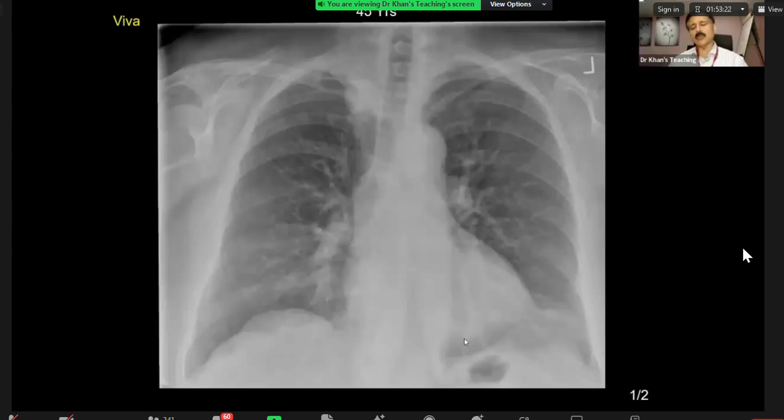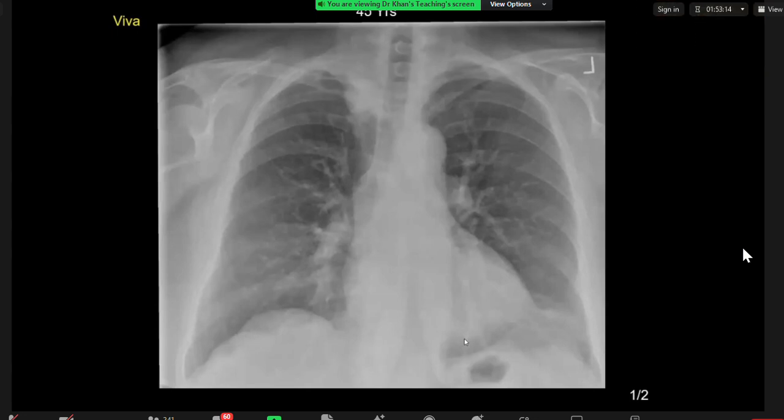Can you go back to the details of the description of this lesion? Hint. What is cervicothoracic sign? So a cervicothoracic sign is when there's a lesion which is going above the clavicle. And so this could be a lesion which is in the superior mediastinum, could be a thyroid lesion as well.